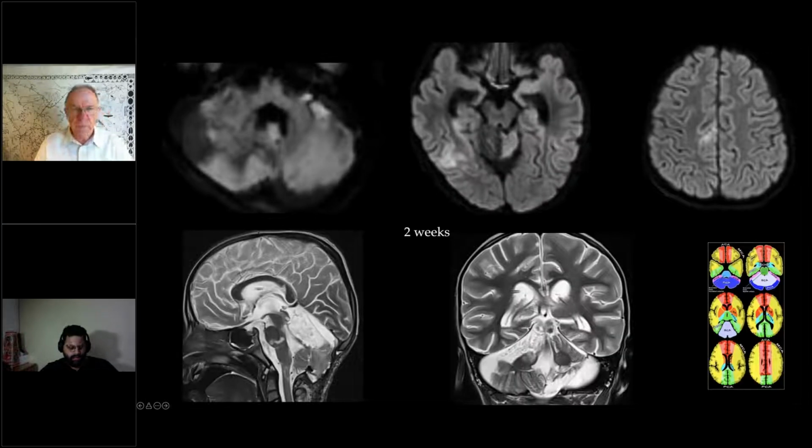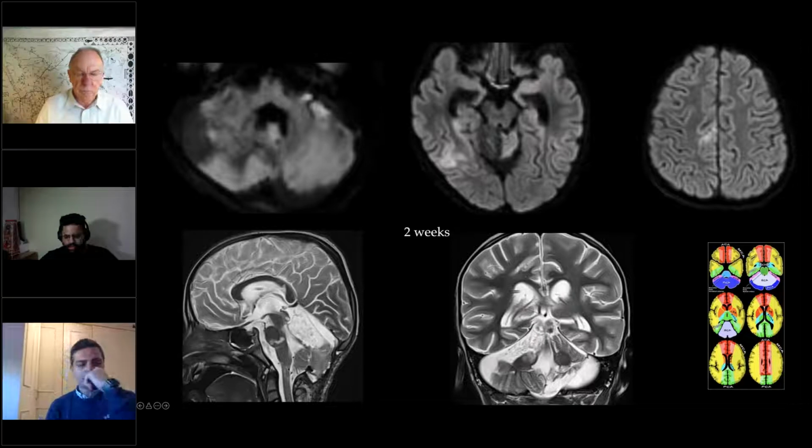The patient underwent decompression, and this is after 2 weeks. As you can see, there are chronic ischemic changes in the posterior fossa, but there is a new change along the right temporal-occipital region, which was not there in the previous study, and also in the posterior cingulate region. The Chiari has somewhat improved, but yeah, these are the new changes which were seen post decompression.